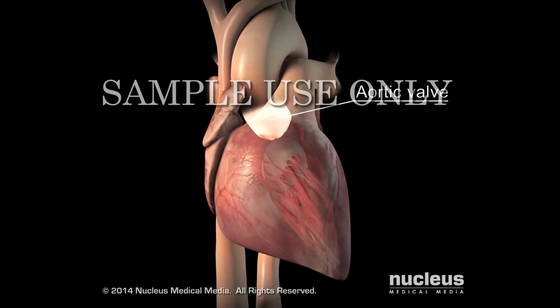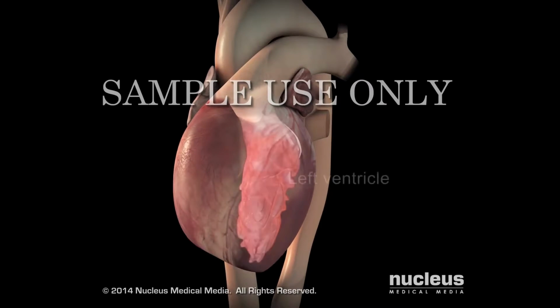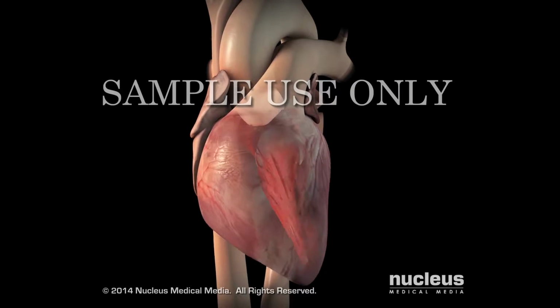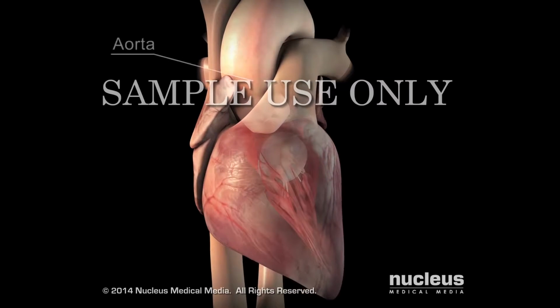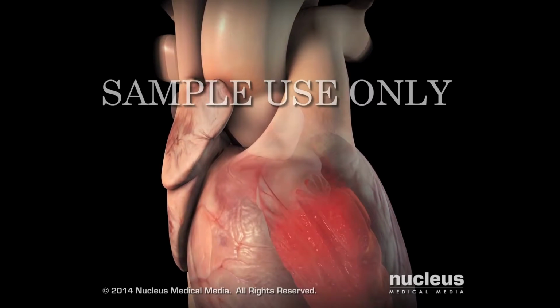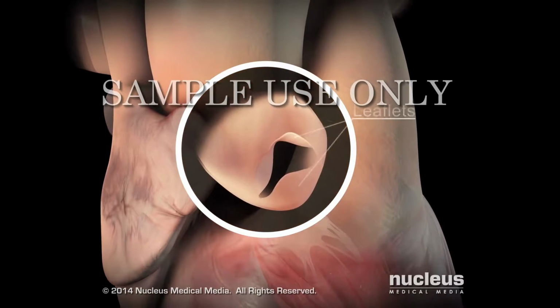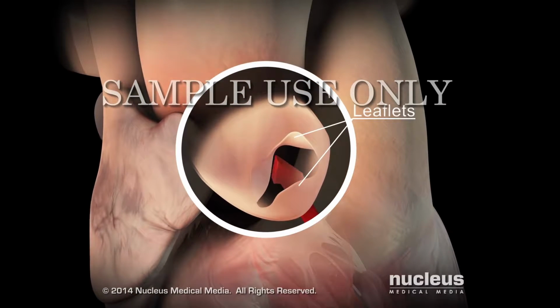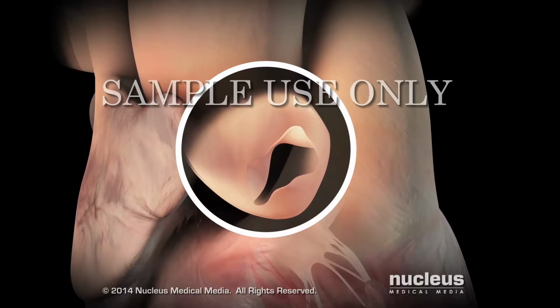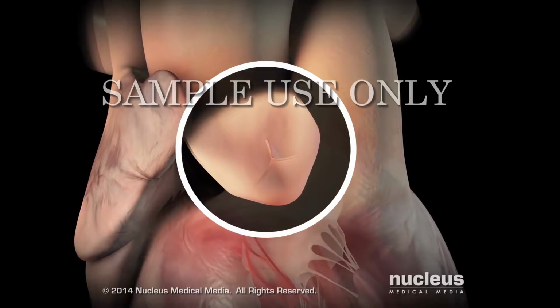Your aortic valve is one of the 4 valves in your heart. It lies between your left ventricle, or lower left chamber, and the large blood vessel supplying oxygen-rich blood to your body, called the aorta. When your left ventricle contracts during each heartbeat, it pushes blood through 3 flexible cup-like leaflets that make up your aortic valve.